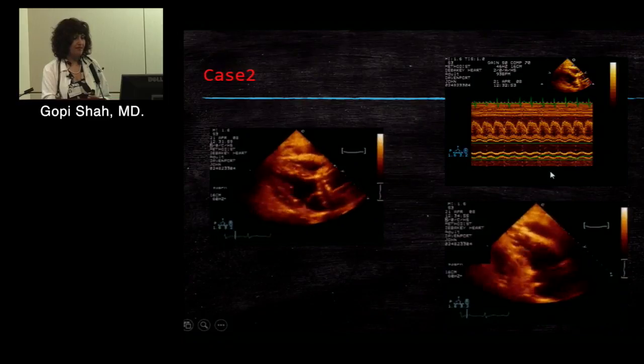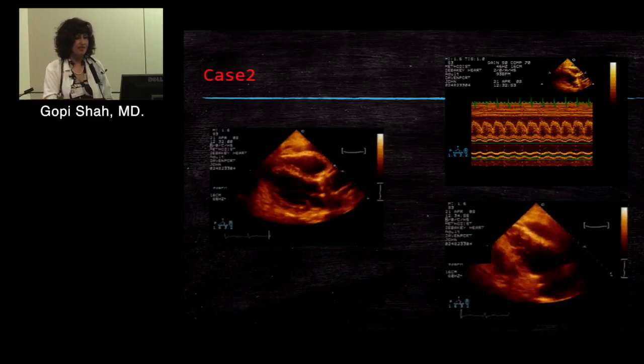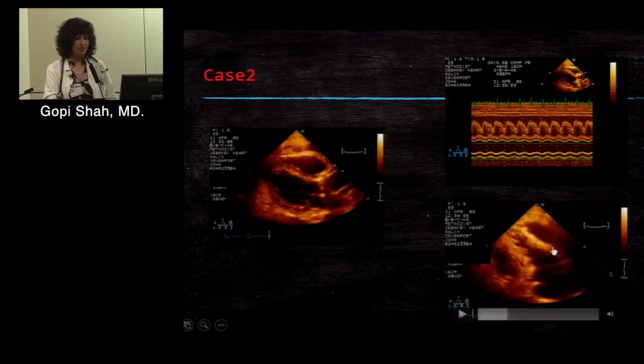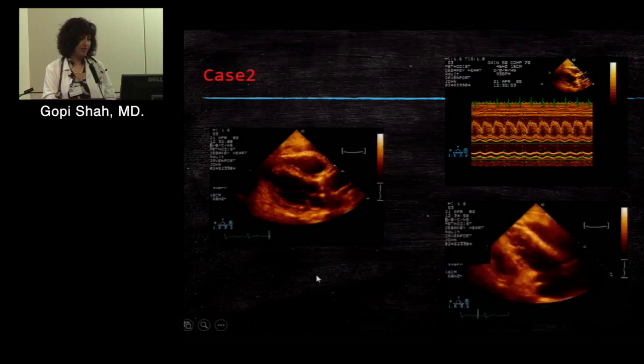And what you're seeing is very beautifully demonstrated by M mode. So why is M mode sometimes superior to our visual subjective assessment? It gives you a really good objective assessment of how beautifully the RV is collapsing in diastole. You see this? That's your RV free wall in the diastolic phase, total collapse and coming out. Again, viewed beautifully in this view, which is your parasternal slightly off-axis RV inflow view.